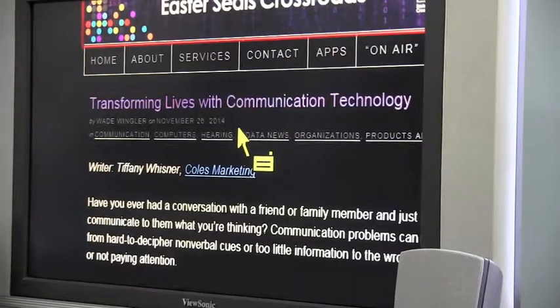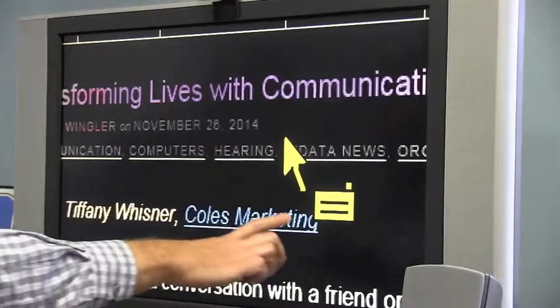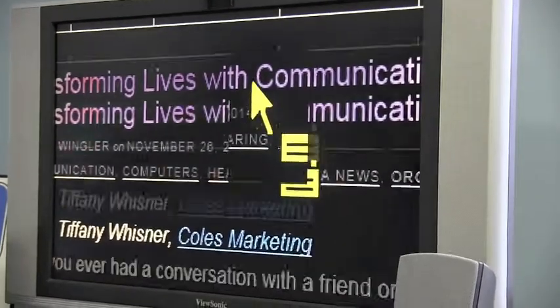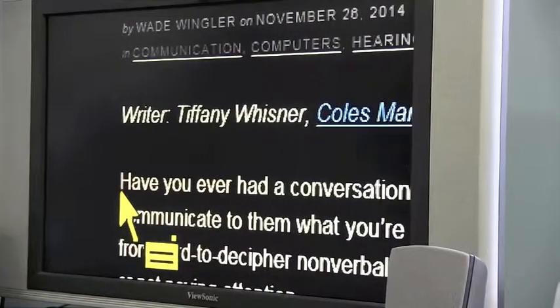Once it is on, the mouse will have a small box next to it, and we'll zoom in a little bit to make it a little easier to see. You can take your cursor at this time and get to whatever you'd like it to read to you.